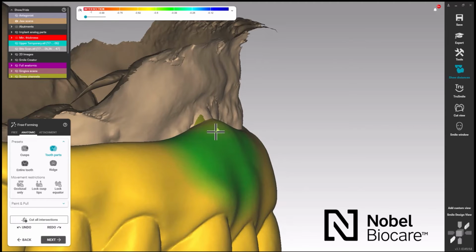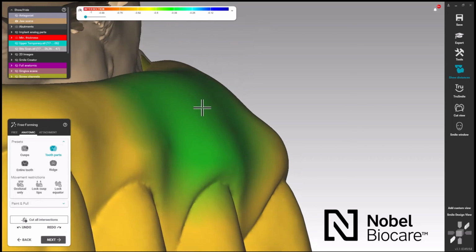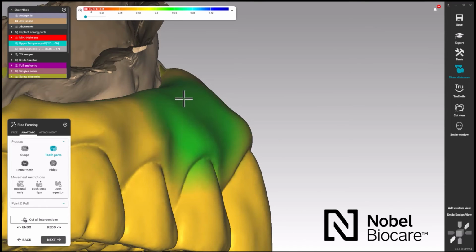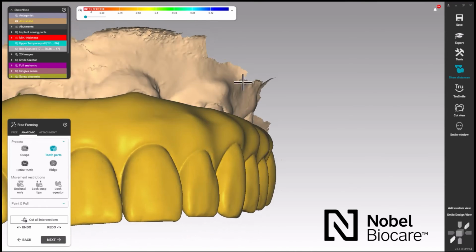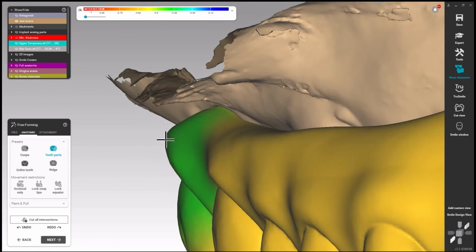And that is the ideal profile for the prosthesis, all right? And so you can really go in and dial that in nicely by just pulling that back without moving the gingival portion of your teeth. It just allows that profile to come in. Unless you want to pull that back a little bit, okay? And I can see that's a little bulky for my taste.